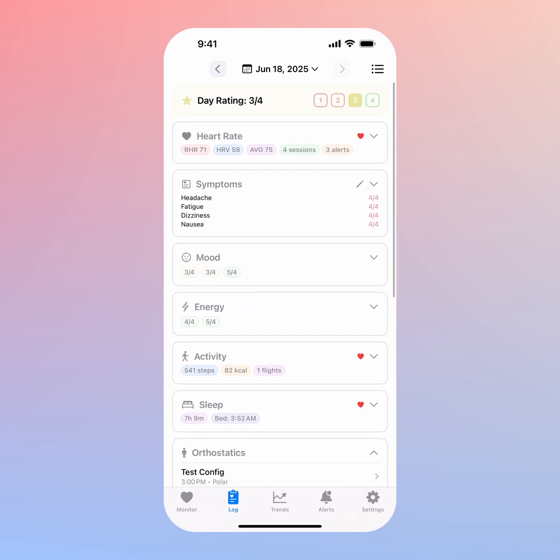And in terms of my development timeline, I want to wrap up these core features in the next week or two, and then I want to start early beta testing after that to make sure everything's working properly and I didn't miss any edge cases. It's very important. And yeah, that's where things are right now in terms of development.